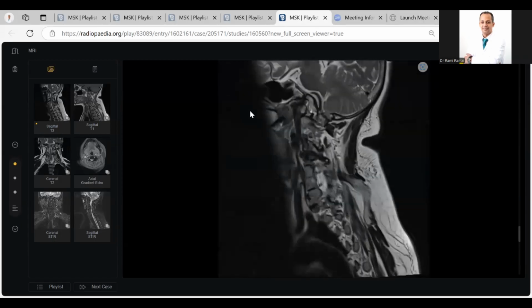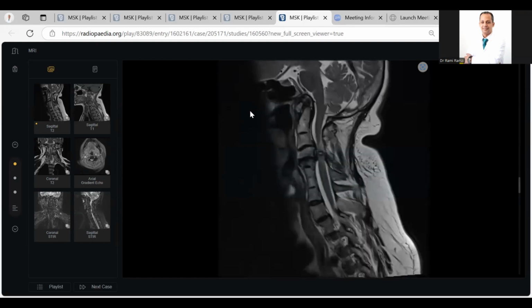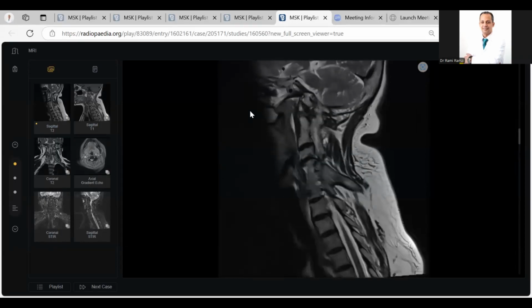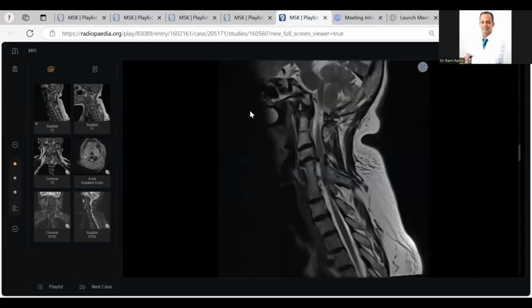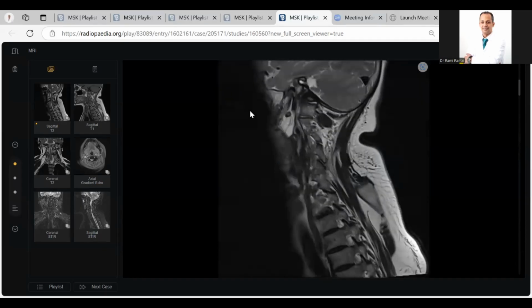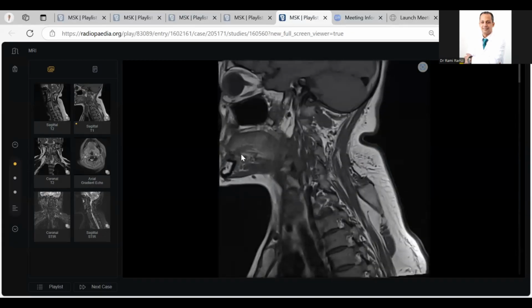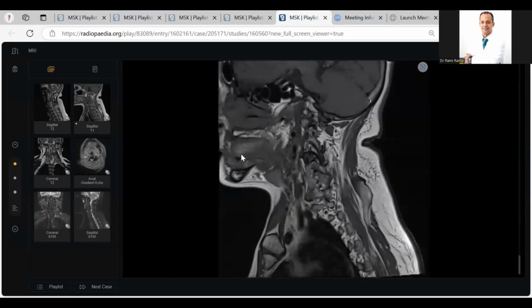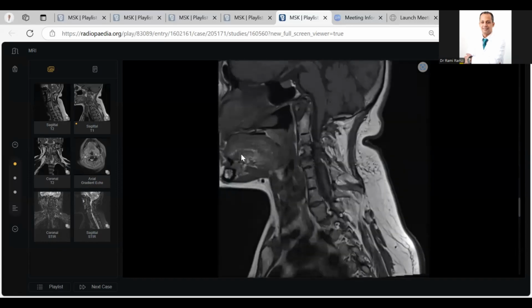I'm presented with the MRI spine, T2 weighted sequence, digital images. I can see there are degenerative changes in the spine, predominantly involving the C3 vertebra, that is extending into the epidural space. I can see an abnormal signal intensity area within the spinal cord in the cervical region that is intramedullary, and it has a complete homogeneous low signal range. I would like to see the contrast of this patient. No need for MRI contrast. This is chronic since childhood.